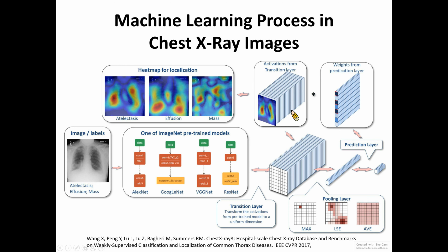Alright, so we already loaded AlexNet into the net variable. On the right, you can see that there is a net variable called a SeriesNetwork. If you double click on this net variable, you should be able to see the 25 layers in this network. You can see the first layer is the image input layer, followed by several repetitions of convolution, ReLU, normalization, max pooling, etc.